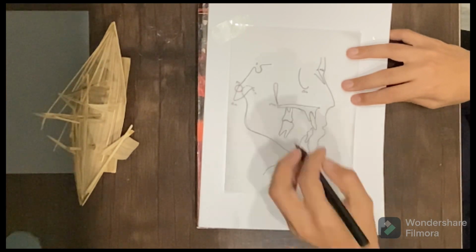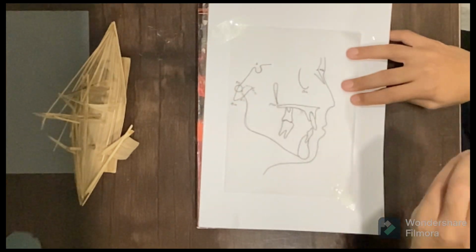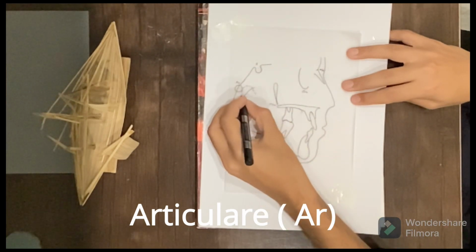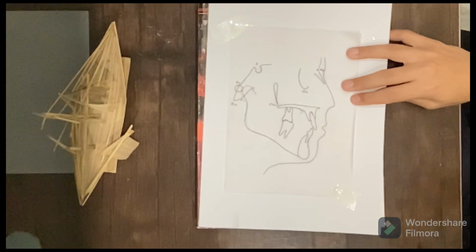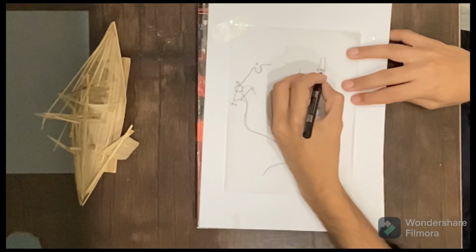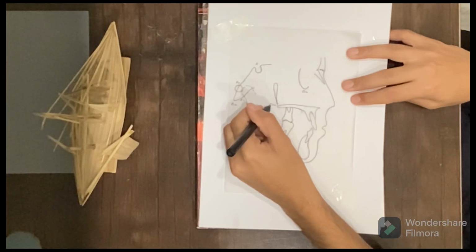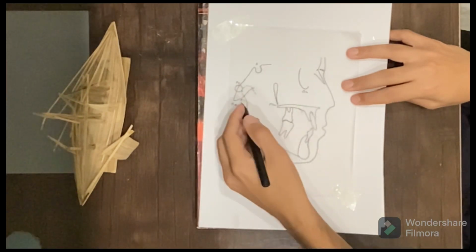The fourth point is articulare. This point is called articulare, and it is the intersection of the condyle and the basio-occiput. So these are the bilateral points, and the three are the unilateral points. Unilateral are nasion, sella, and basion, while the bilateral points are orbitale, pterygomaxillary fissure point, porion, and articulare.